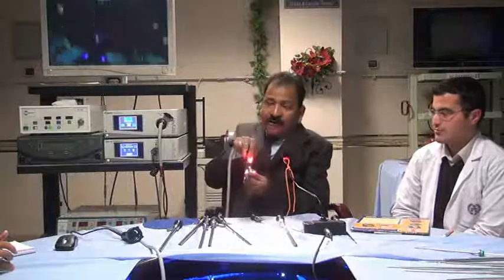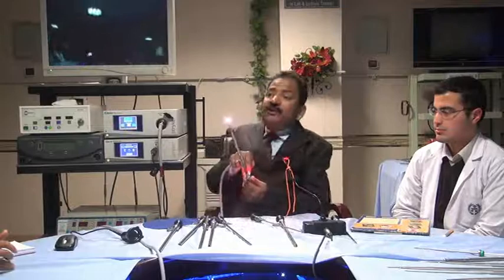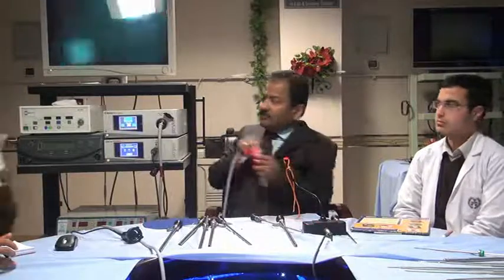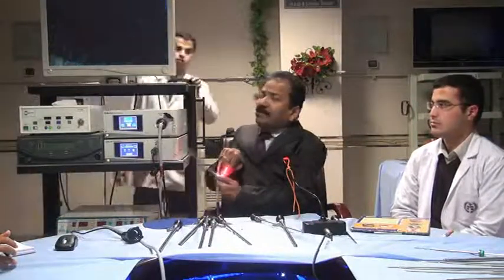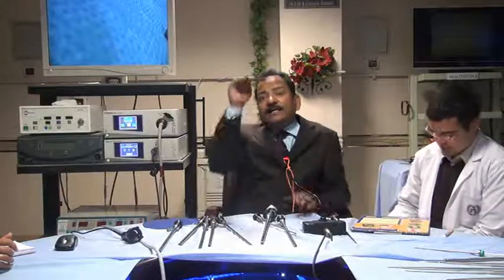That's why nowadays all the companies put the light only from the top. See here, light is not on the bottom. Is there any light on the bottom of the telescope? Bottom is light free. There is no light on the bottom. Small area, 6 o'clock. At 6 o'clock only, no light. All around, but maximum is on the top. Why is it on the top? So that the shadow will be down.